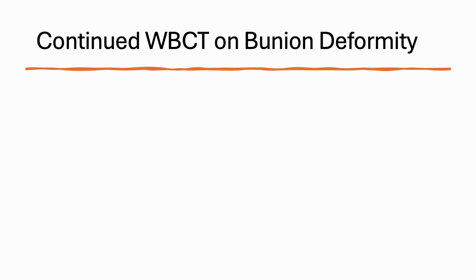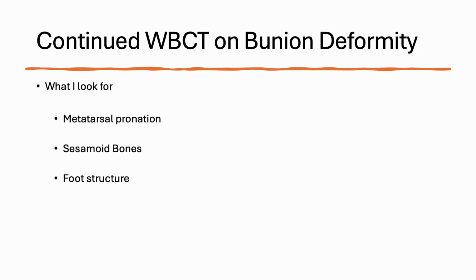Weight-bearing CT scans on bunion deformities. What do I look for? I look for metatarsal pronation. I look at the sesamoid bones, and then I look at the foot structure.